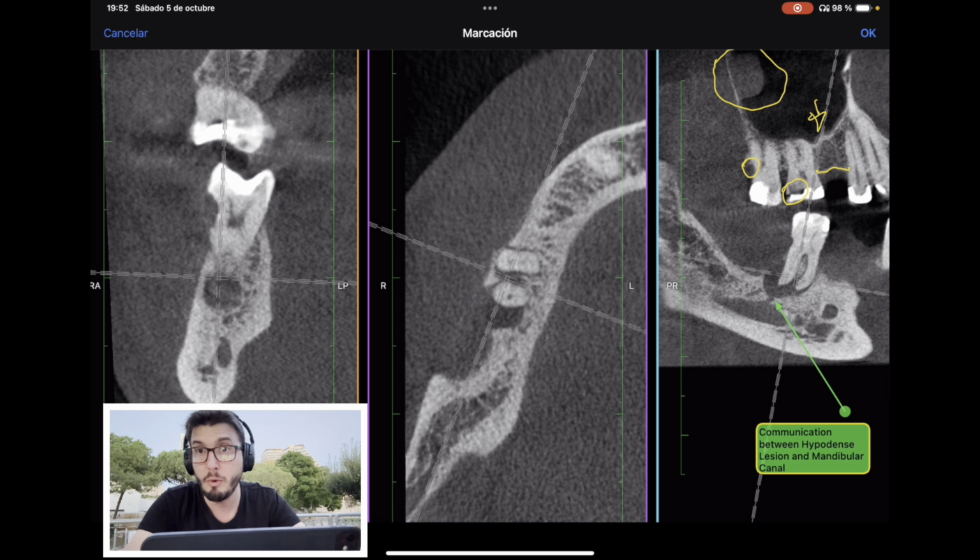But we have a video only about CBCT implant planning with implant planning software programs, and I will also put the link here on the top right corner of this screen, so it will show up at some point. Now, of course, we have this metallic restoration here of this premolar as well, but to assess the adaptation here with artifacts is also a little bit challenging. I'm also realizing that this could be the third molar and this the second molar, but okay, we are just discussing the diagnosis of what we are seeing.